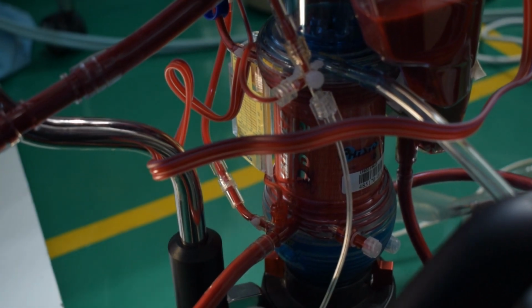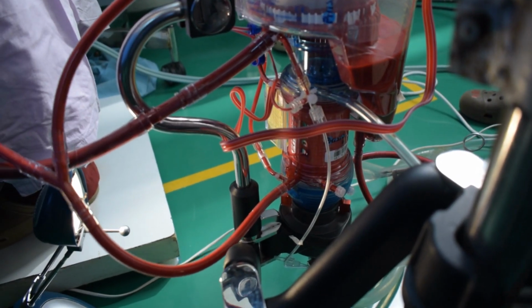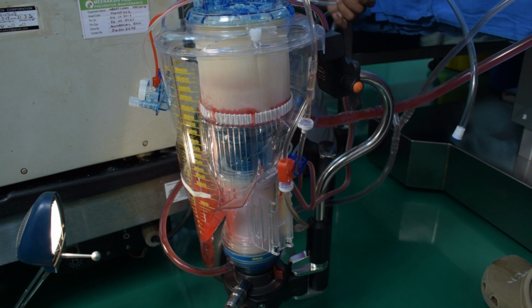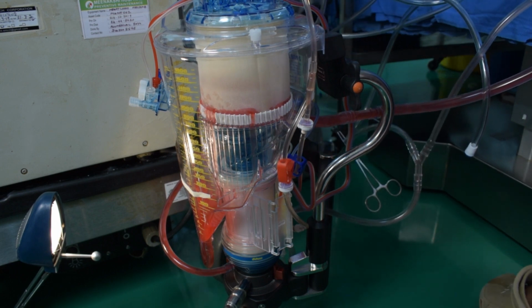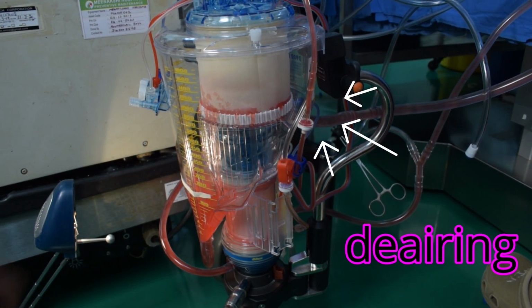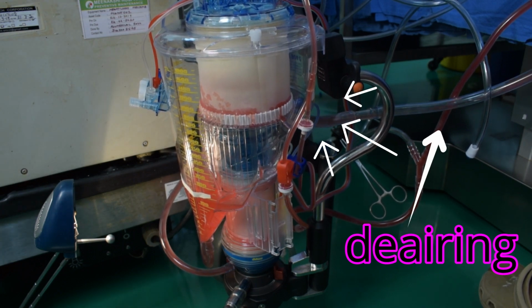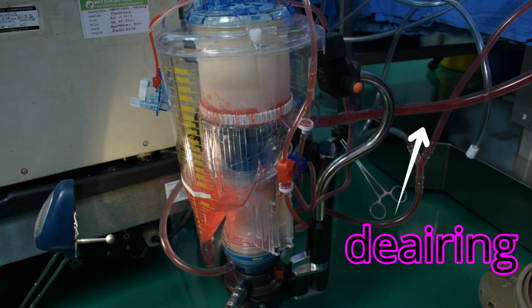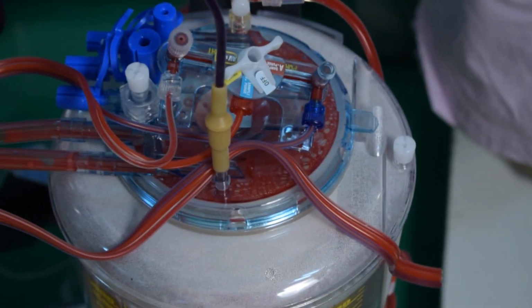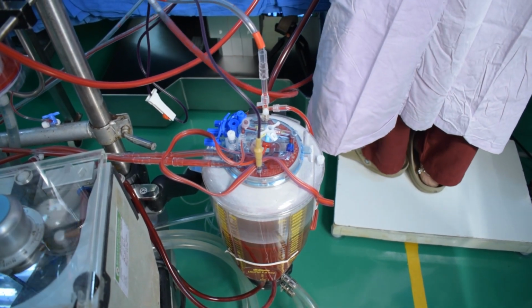status. Having said this, whilst on cardiopulmonary bypass, it's very common to find the PaO2 levels in the range of 250 mmHg plus to adjust for the hemodilution and the limited reserve capacity of the membrane oxygenators. The oxygenator represents the largest source of non-endothelialized surface area in the whole cardiopulmonary bypass circuit, and therefore it is important that the device is meticulously primed to remove all residual air before establishing cardiopulmonary bypass. In an effort to reduce the surface area exposure and prime volume, newer generation oxygenators have inbuilt arterial filters.